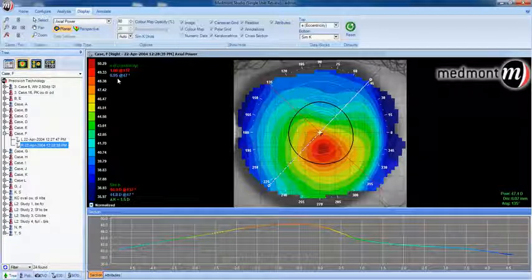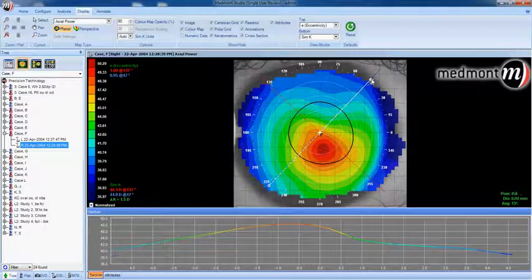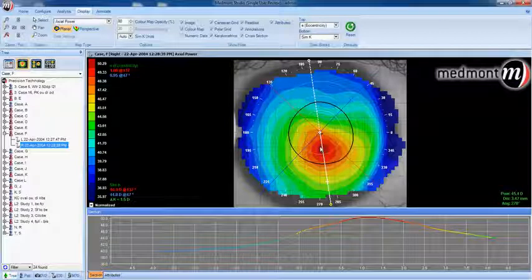Eccentricity value is a measure of possible disease. The higher the eccentricity value, the more abnormal the eye. 0.8 would be the threshold for normal versus abnormal. In ectatic eyes, with the steepest point in the cornea being close to the visual axis, if there is a very broad range of change from the steepest point to the flattest, from center to periphery, that can be indicated in the eccentricity value. So the greater the E value, possibly the better indication of disease. Again, normal would be under 0.8 eccentricity.